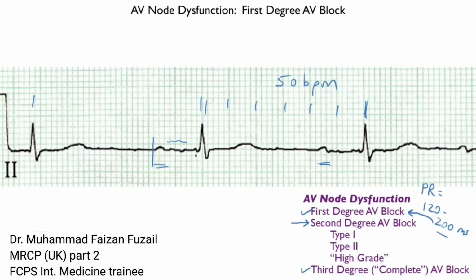So the question is, where does a QRS start? Does it start with this little bump, or does it not? If you look at this QRS complex, it seems to have a little bump. There is almost like a double bump, and if you look at this first QRS complex, there's no bump. So when you're trying to decide exactly where the QRS starts, if you only have one lead to look at, the QRS really does start with the first upward deflection; this first bump doesn't count. So if we say the QRS starts with the upward deflection, that would be about here.